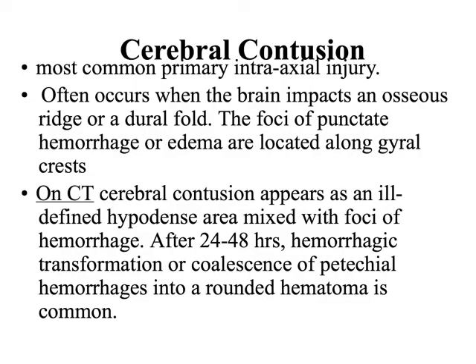Cerebral contusion. So this is one of the more common primary intraaxial injuries, and it can occur when the brain impacts an osseous ridge or dural fold. And what we're looking for is an ill-defined hypodense area with foci of hemorrhage, and after a day or two, that hemorrhagic presence is going to coalesce and kind of round out.